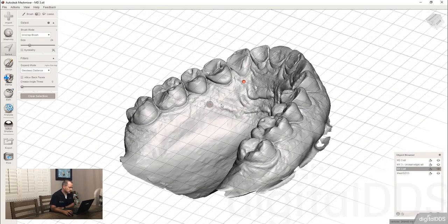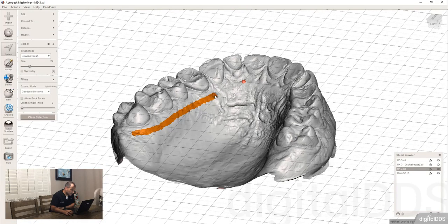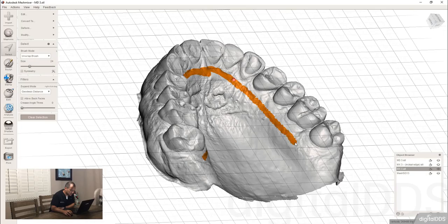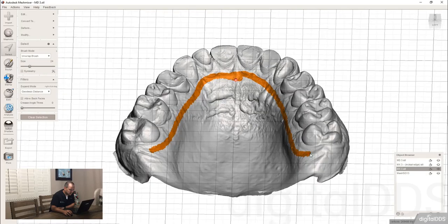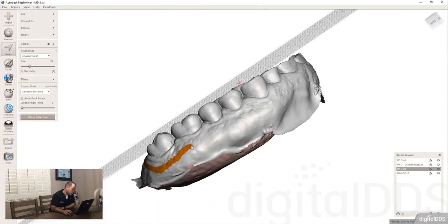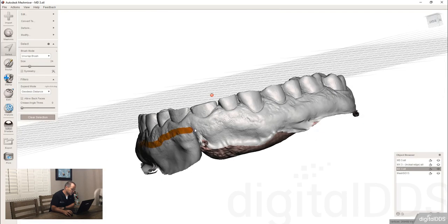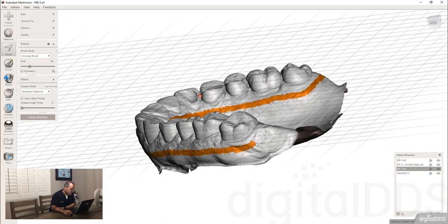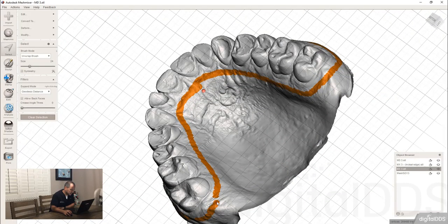All right, let's do this instead. Normally when you use the lasso, when it connects on the other side, it will select an area. But maybe because there's so many triangles, it was struggling with that. So we're going to do this instead. I'm going to come along. I'm not going to worry about smoothing anything.